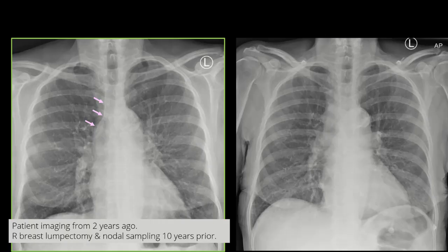On the current image in the patient, do you see the paratracheal stripe? It is thickened. This could indicate that there is a mass in this region. The patient should undergo a CT to better visualize this area.